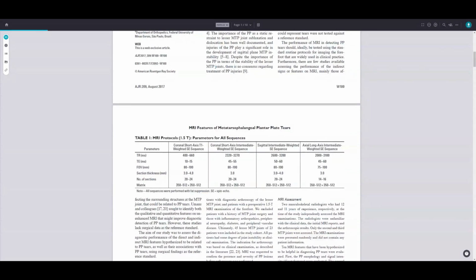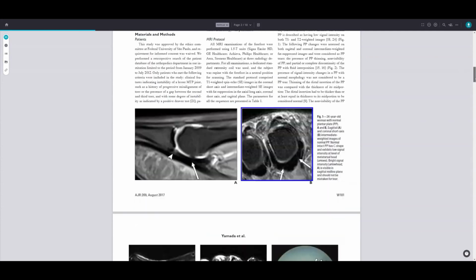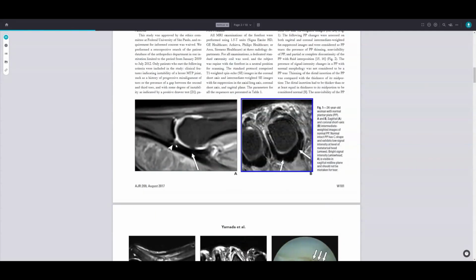So having slice thickness of 3 and 4 millimeters, as we've talked about in the lecture, and having a smaller field of view, the field of view being on the order of 8 to 10 centimeters, and not trying to take in the entire foot, are parts of your clinical excellence and putting into your imaging so that you can get images that with clarity show the plantar plate as a structure invested into the proximal phalangeal base, looking at the flexor tendon here, the U-shaped structure, helping us to pick out where the flexor tendon and tunnel is with regards to the plantar plate, the accessory collateral ligament and the proper collateral ligament, that thinner band.